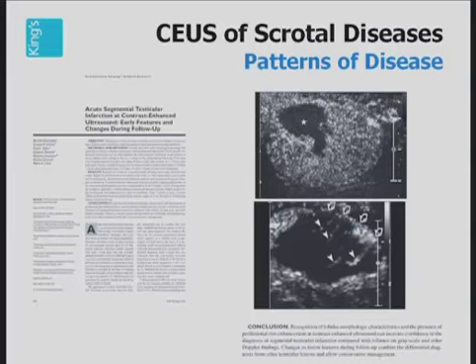This is an important paper published by our group to demonstrate that these appearances are seen in many patients with segmental infarction, and you can follow this pattern over a period of time with regression. There is enhancement in the periphery of the lesion. There's sometimes enhancement of remaining areas of vascularity within the lesion, but follow-up will always show regression.